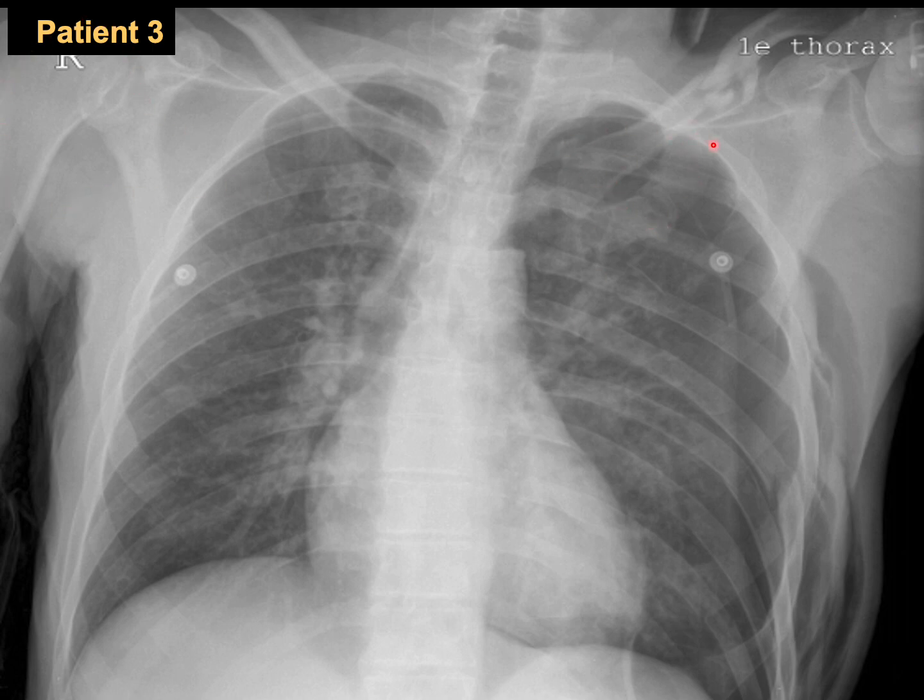If you go down here, you will find that we are having more than one fractured rib here, for example. And if you get away a little bit and compare the distance between those ribs with the distance between those ribs, you will find that there is some crowding here and a discrepancy between the distance between each rib and the other one. So this might be the clue for having some fractures here.